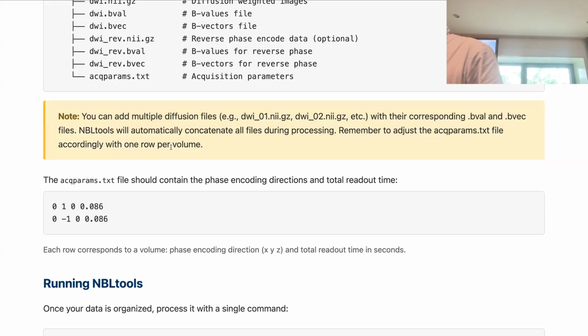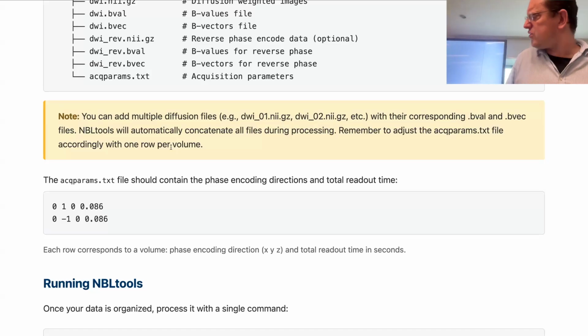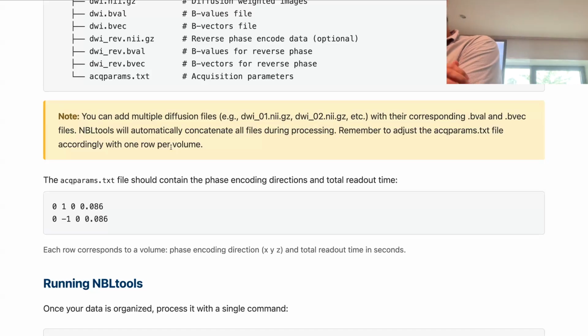Okay, this is useful only to have the right one if you use the field map for another acquisition. So for the same acquisition, you just put this number, it's fine. If you have one direction, one phase encoding direction, you only put 0, 1, 0 something.